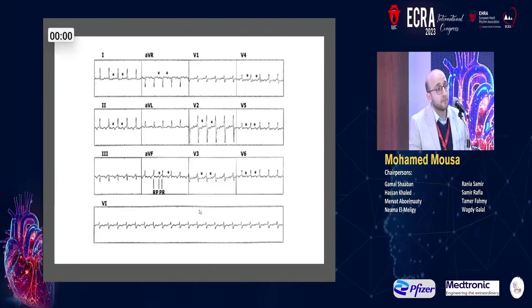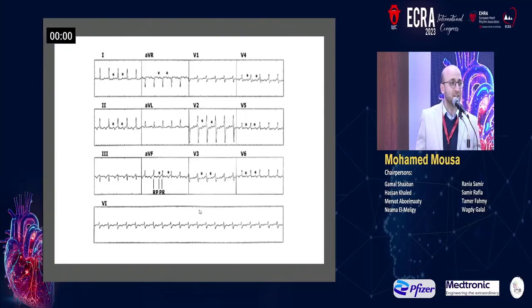So when I see this 12 lead ECG, I have to do maneuvers just to make sure the AV node is out of the picture, to see what the underlying rhythm is. I will not just send the patient for ablation without doing more maneuvers, because this could be a flutter. Okay, I'm with you. I'm getting it from UpToDate. It's already diagnosed as atypical AVNRT.